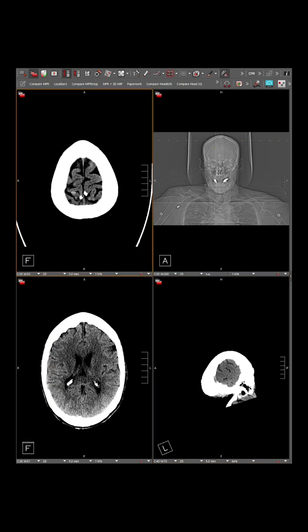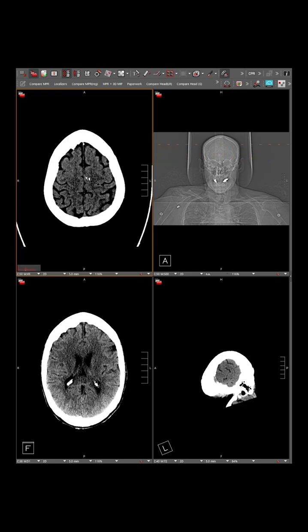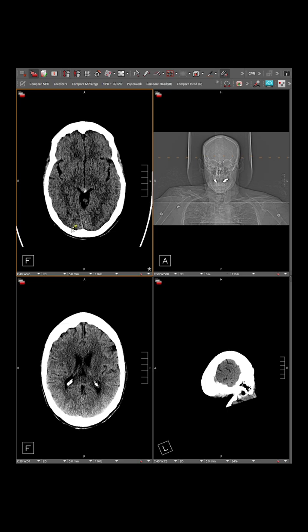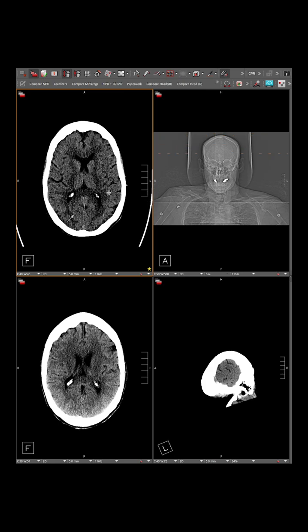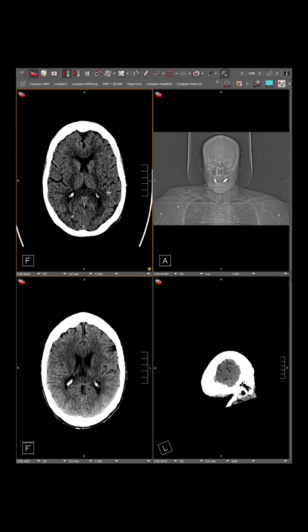One of the last couple things that are useful to think about is that if you have a number of annotations on a sequence, let's just say I've thrown a number of arrows on here, you can actually jump through these by pressing F12. Okay, so that's actually very helpful. So instead of reporting image numbers when you want to remember things, you can press F12, and then F11 goes backwards through them. So F11 and F12 are the hotkeys for that.